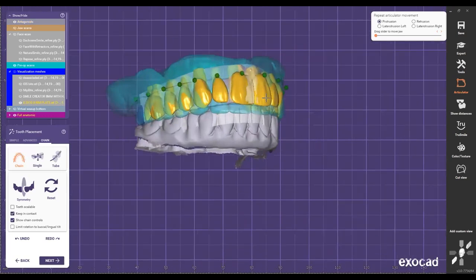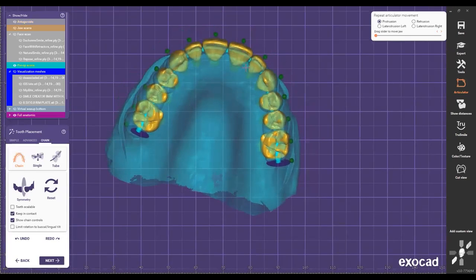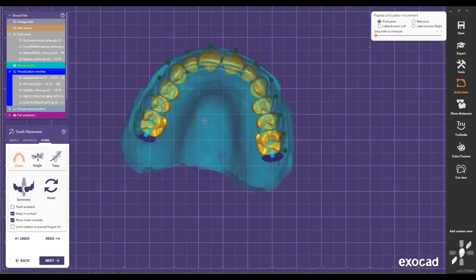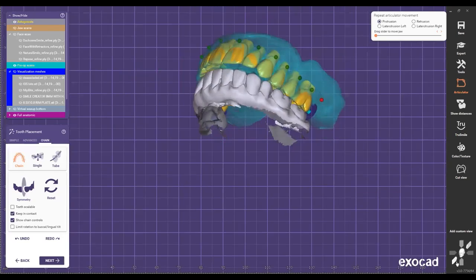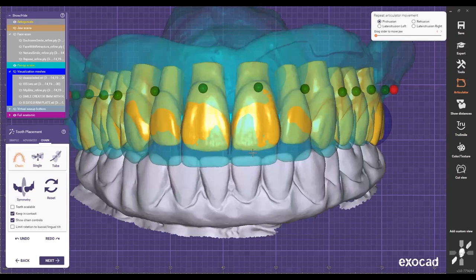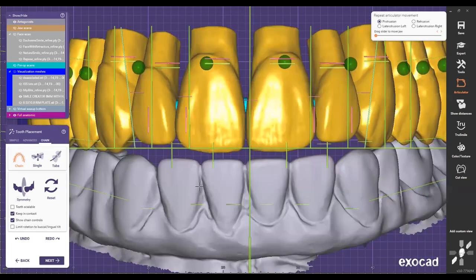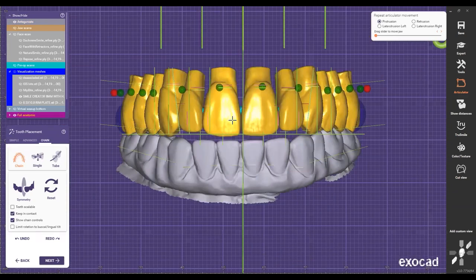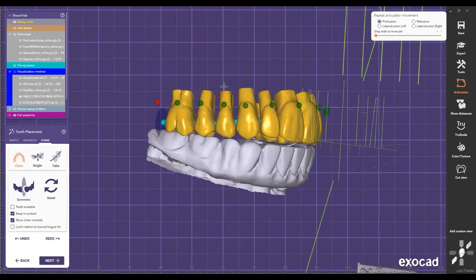That way I can start sliding it there, because I know that the lip support is right on this patient. So then I can go back and lock them. Then I'm going to go here, and we say that we're going to keep them, in this case, following this, right? But this is one thing that is nice to know: when we do this setup, the teeth right here are going to be showing a space right here.